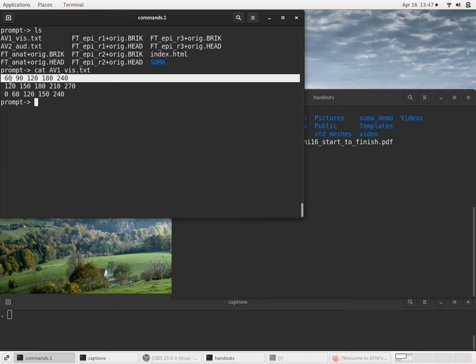But importantly, when we give them to afni_proc, we need to know whether the pre-steady state time has been removed from these. You can remove it or not, but you have to make sure afni_proc handles it correctly. So in our case, we're planning to tell afni_proc to remove the first 2 time points of every run.